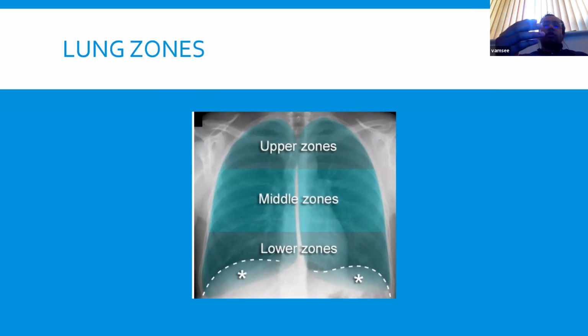So whenever we're talking about the lung field specifically, we refer to zones of the lung when it comes to the chest X-ray. We very rarely mention directly, oh, there is this pathology in this lobe. The only circumstance we do that is if we've got some other indication of localizing it. But otherwise, whenever you're talking about pathology, if, for example, there's a solitary lesion in the right apex, I would refer to it as a solitary well-circumscribed lesion in the right upper zone.